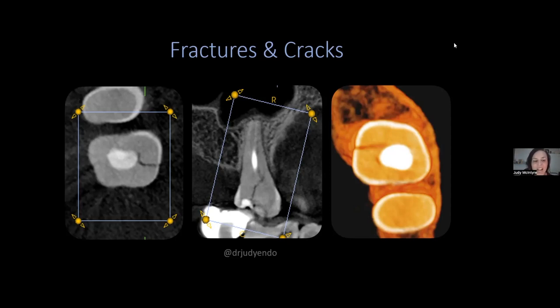So today, I would like to show you and share several cases where CBCT has been helpful and definitive regarding how to proceed with cracked and fractured teeth. In other words, how CBCT and my diagnostics has helped me diagnose a crack or a fracture, and then from that information, which ones both the patient, the restorative dentist, and I want to focus on saving.